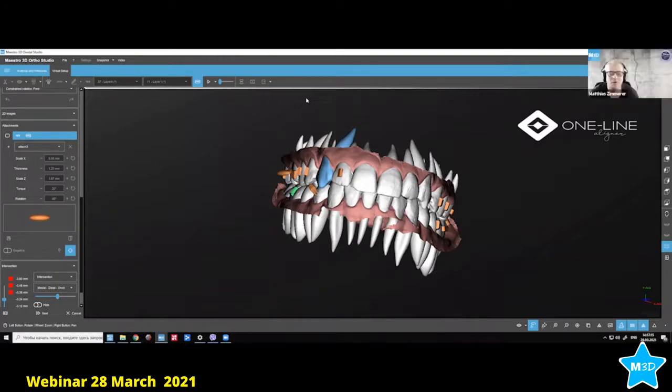It's no effort for you? It's nothing. You said I must have it? No, nothing. Okay. How do you remove it after the suck down? We can remove it very easily. The way you normally remove other attachments, it comes off easily. There's no problem at all. This model which I showed you was already after the suck down, so the attachment didn't come off. It also depends on your resin, because if your resin is good, then you won't have this problem.